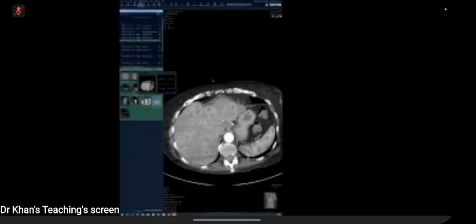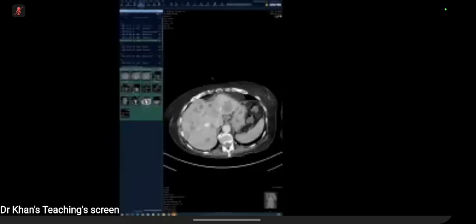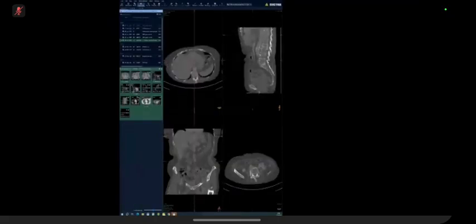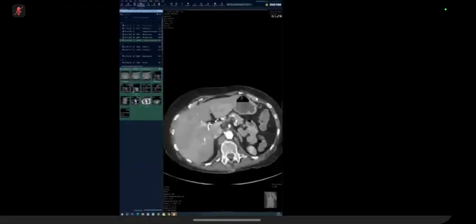So then this could be a multi-organ process. Anything else you want to review? There's a spiculated mass in the left mammary region. So a tiny spiculated mass. So this could be a primary breast cancer. There is also a collapse of the L2 vertebra.